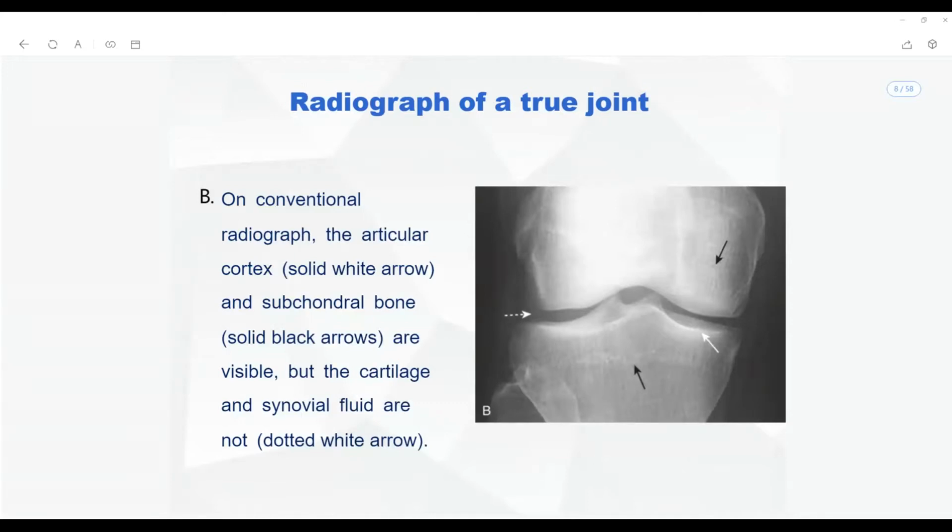What joint is this? Does that look like an elbow to you, Shafiq? What joint is it? Anybody? It is a knee joint. Okay, is it a right joint or a left joint? Right side, left side? Okay, it is a right side knee joint.